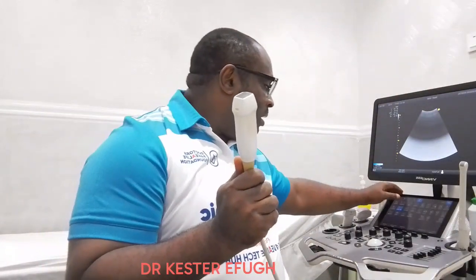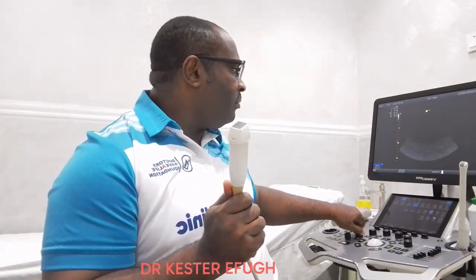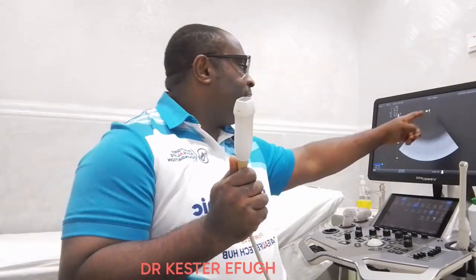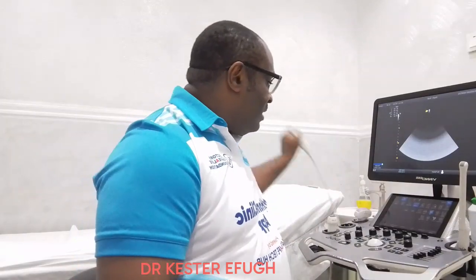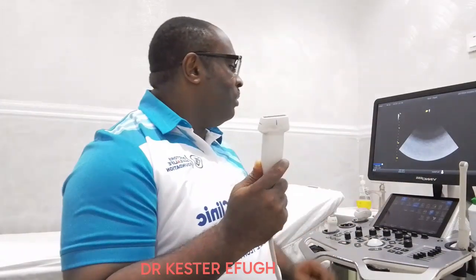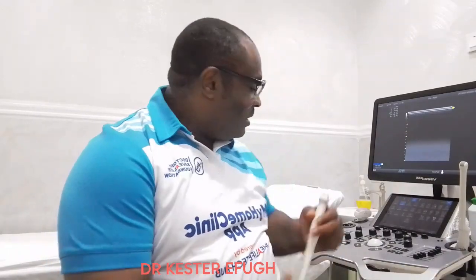When we activate the cardiac probe on the machine, you see that it has a trapezoid shape but with a sharp upper border, unlike the curvilinear probe. And when we activate the linear probe, we have a field of view that is rectangular in shape. So this is important for those that are going for practical exams, and you can be asked this question.